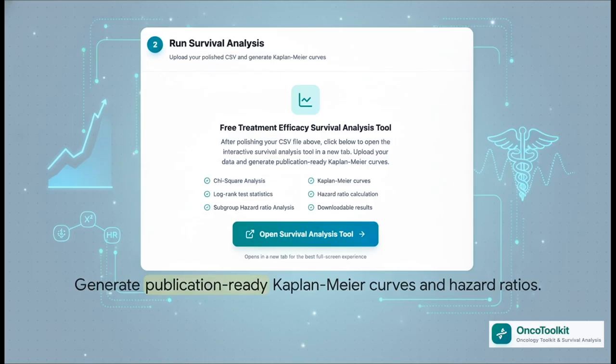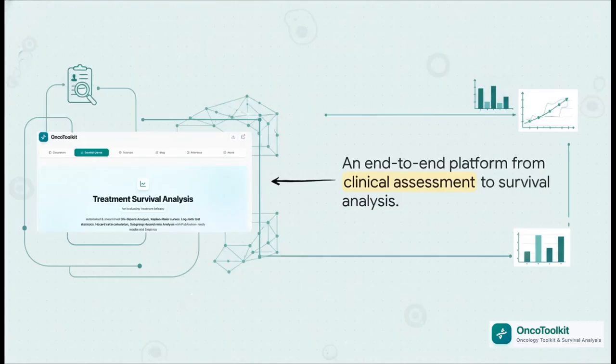And from there, you just take that clean, polished data and plug it straight into the survival analysis application. This is where the magic happens. You can generate publication-ready outputs. I'm talking Kaplan-Meier curves, log-rank tests, hazard ratios, all of it, automatically. So what you're really looking at here is the whole journey. It's an end-to-end platform that takes you all the way from an individual clinical assessment in the exam room to a powerful, automated survival analysis for your entire patient cohort.